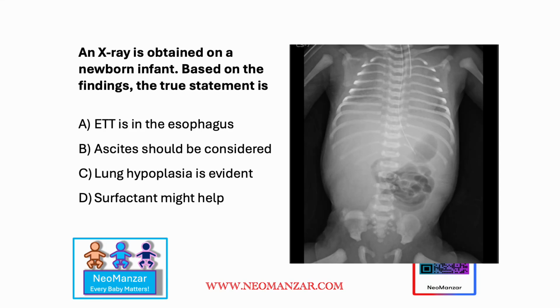So here we have an X-ray which is obtained from a newborn infant. Based on the findings, the true statement is, so the statement could be right, but which is the best statement, you guys think? So what do you guys think is the correct answer here? Pause the slide, zoom the picture. Okay, the correct response here is surfactant might help.